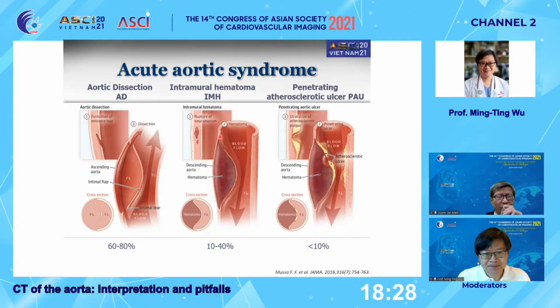By classical definition, there is no intima defect and a large blood clot, accounting for 10 to 40%. Penetrating aortic ulcer: there is a pre-existing ulcer and plaque, which develops a penetrating ulcer to cause pseudoaneurysm or focal IMH, and it's less than 10%.